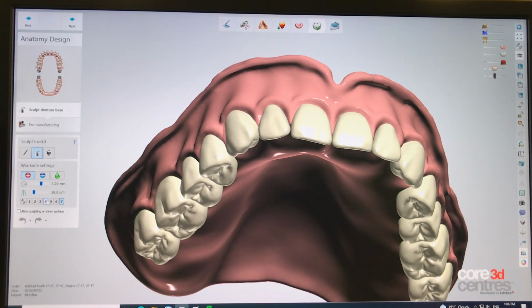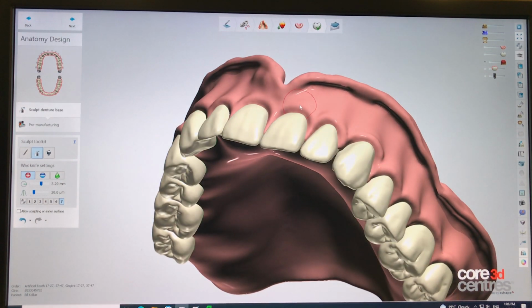So no matter what happens here, if I hit number 7, that's my favorite, I'm going to go to that. So if I'm happy with that, I'm going to hit the plus sign, come over to the area that I want to sculpt, left click and hold, and now we're adding material, which is quite a bit. That's too much material added at one time.